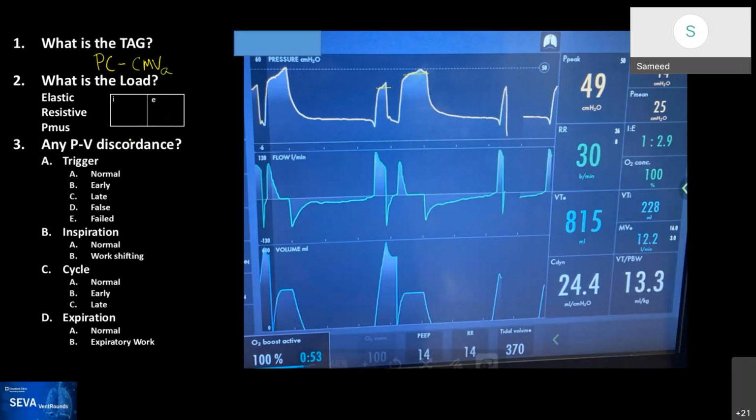In terms of load, we're seeing something similar, these peak inspiratory spikes due to impedance. But the interesting thing is that in at least the central breath that I can see, the flow waveform goes fairly high and then doesn't show that plateau, but the second breath immediately after shows a plateau.